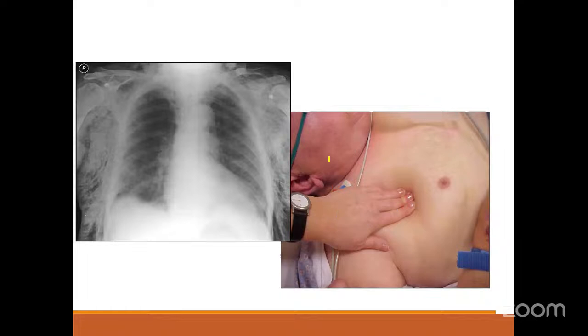Here you can see a patient who is very red, inflamed, with swollen skin and chest wall. And the X-ray done is not showing anything much within the thorax. But you can see the soft tissue, which ideally should have been dense and opaque, is filled up with black spaces. That means there is air in the soft tissue, what we call surgical emphysema.